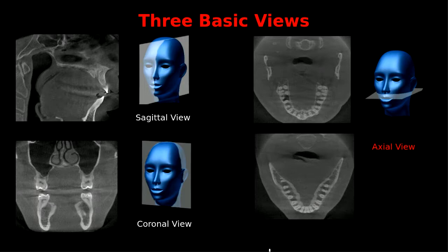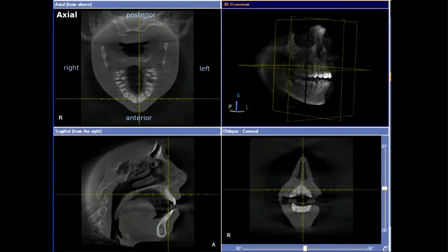You have to really know these three planes in 3D imaging; they are very useful for you. You may have this in your exam too. I will pull up three images and ask, which one is the axial one? Which one is the coronal one? Or which one is the sagittal one? So they'll be in your midterm or final exam. Anterior means front, posterior means back, and this is the left side, that's the right side.